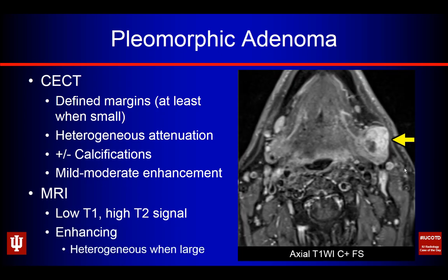In terms of enhancement, they tend to enhance a bit avidly, but it's also typically fairly heterogeneous in its enhancement as well, particularly as they get larger. As you can see here, very heterogeneous enhancement of this tumor.